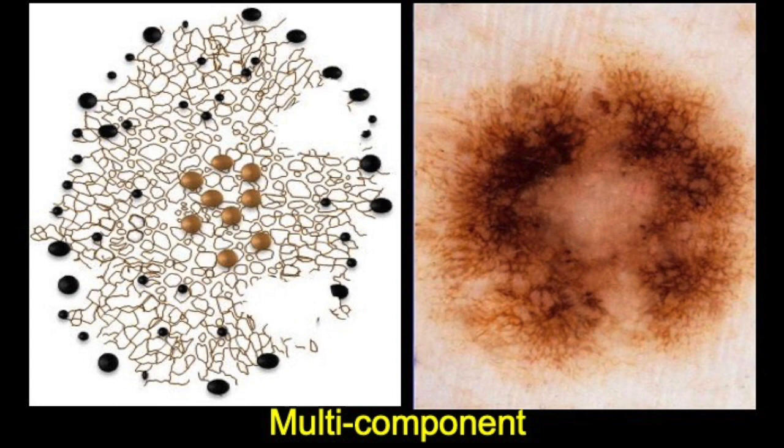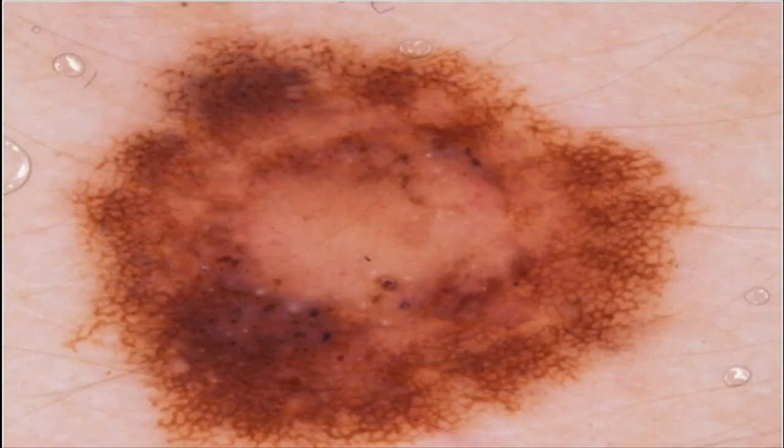And when you see one of these, if you look at the other nevi, many of the other nevi will have a similar morphology. That's the context that this is acceptable in. If you take this as an isolated lesion here, it becomes concerning. So that's the context again that plays in, right? So those are your context, the nevi that require context to know what you're going to do with them. In these cases of the atypical mole syndrome patients, we would never ignore them. We'd say they're benign, but we would monitor them. We would never say go home, goodbye, right?